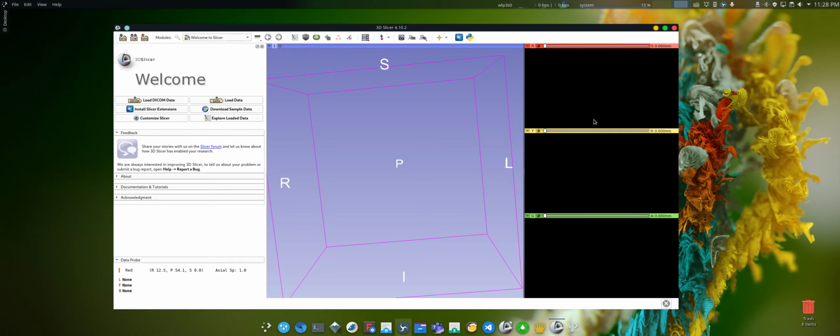In the first step, we'll load in the raw data, look at the data, and then reduce the size of the data by cropping the image to focus on the organ that we'll process in the next step.